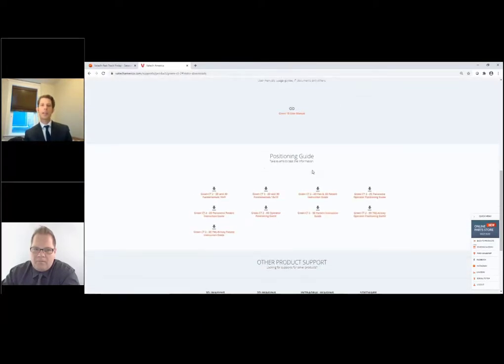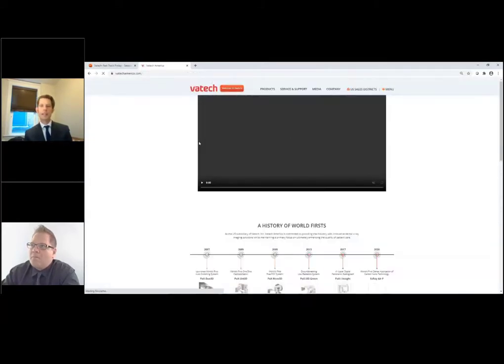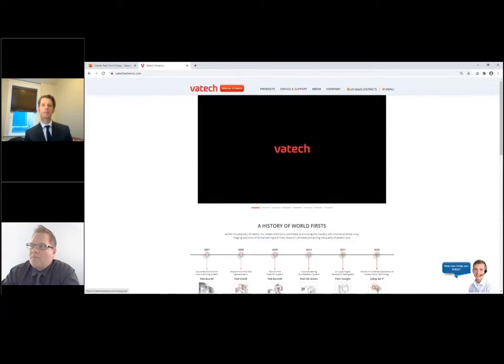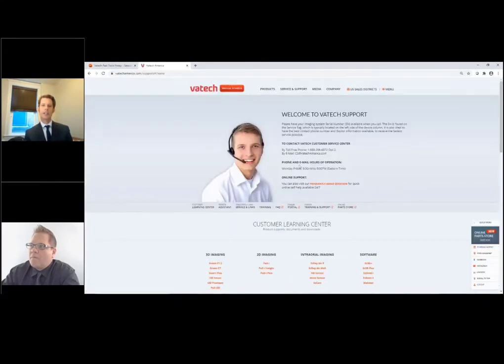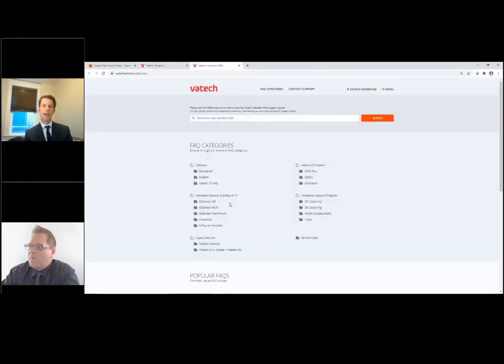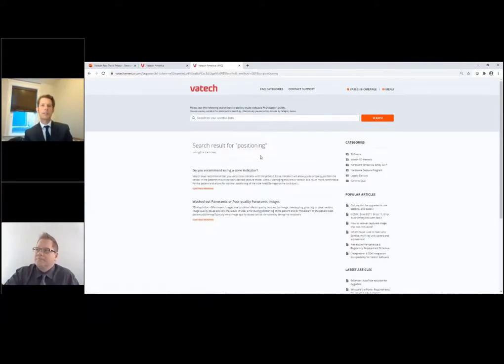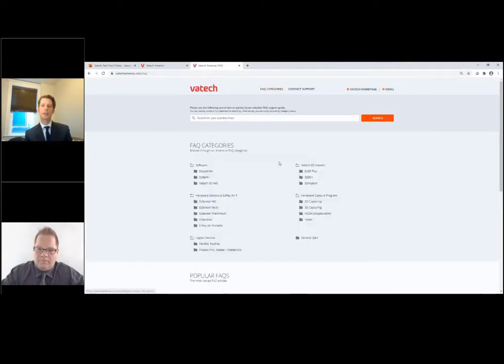Some other questions we get are troubleshooting questions. How do I export a scan, or how do I save a file on a disk? I have my FAQ here, which has commonly asked questions. I want to know about positioning, and it brings up different views. Panoramic positioning troubleshooting, or can I upgrade my software? Things like that are all going to be through this FAQ here.